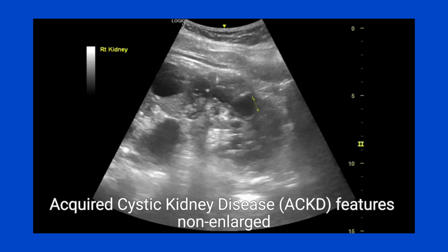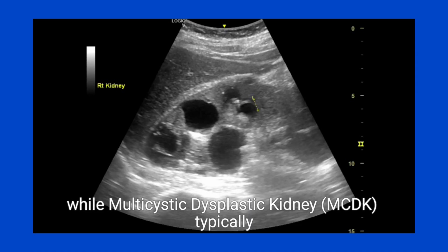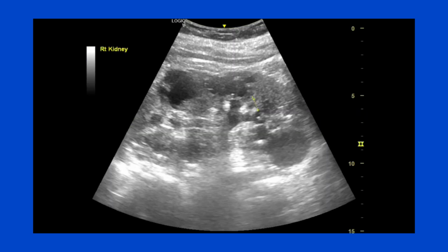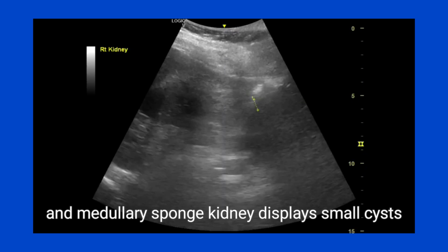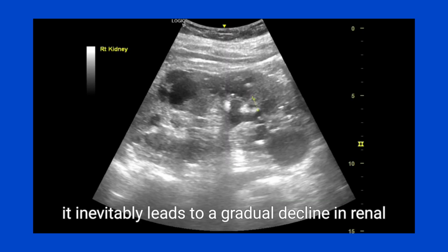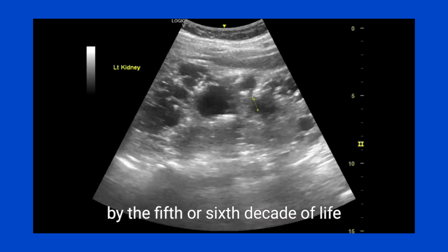Acquired cystic kidney disease, ACKD, features non-enlarged kidneys with uniform cyst sizes, while multicystic dysplastic kidney, MCDK, typically appears as a non-functional unilateral mass. In contrast, simple renal cysts present as solitary entities, and medullary sponge kidney displays small cysts without gross enlargement. As ADPKD progresses, it inevitably leads to a gradual decline in renal function, often culminating in end-stage renal disease, ESRD, by the 5th or 6th decade of life.